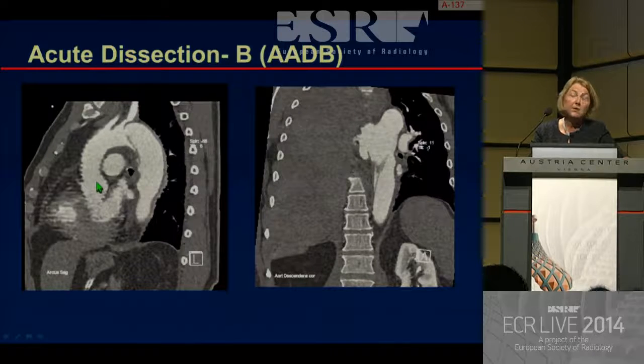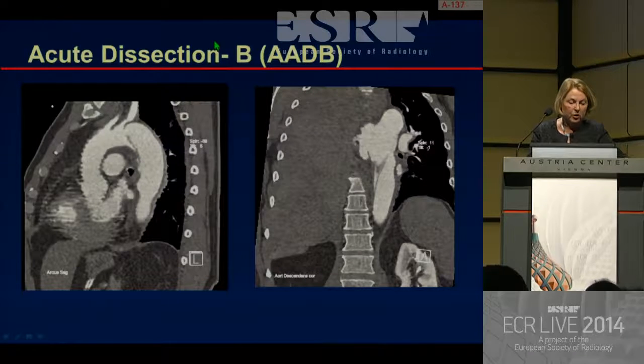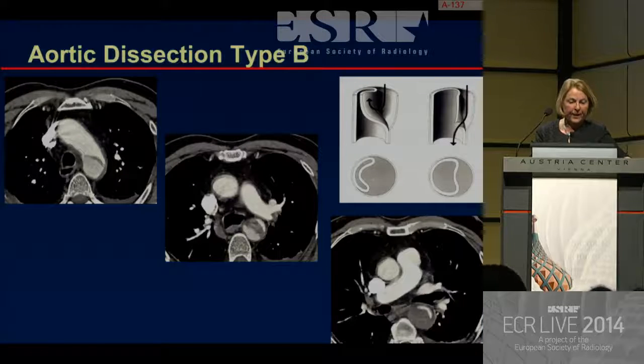By the way, these are relatively old images, not ECG triggered. You see the pulsation artifacts. So even with older scanners, appropriate intravascular contrast, you are able to do these diagnoses.